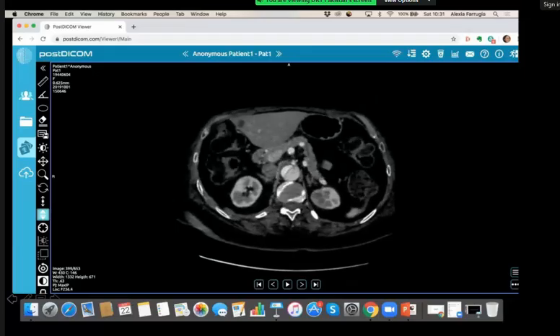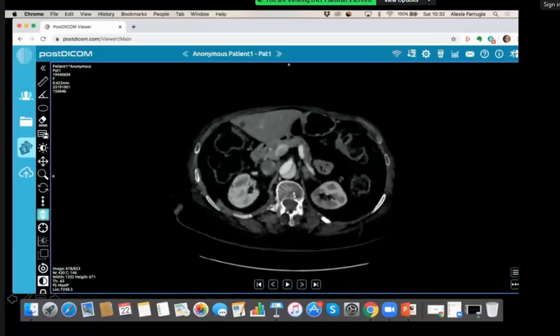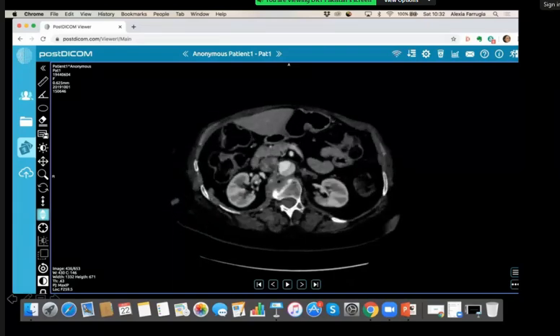So I think it does extend. Yep. So the celiac artery is present. That's coming off from the true lumen. And then I'd look at the SMA as well, and also coming off the true lumen. Perfect. So they're both coming off the true lumen.